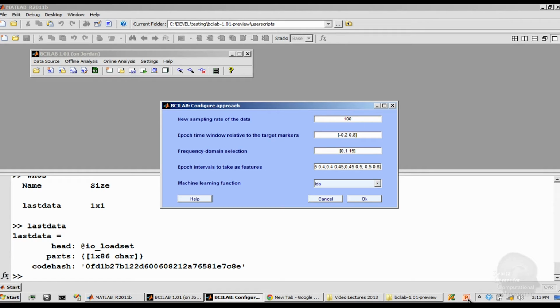So, hoping that I have no typo in here, I double-check this. If something doesn't work, especially in the tutorials, you basically know that you have a typo somewhere.